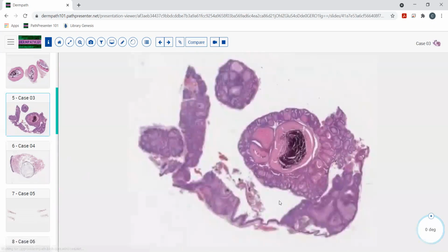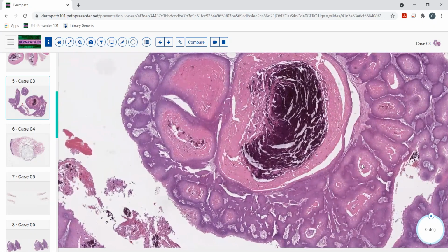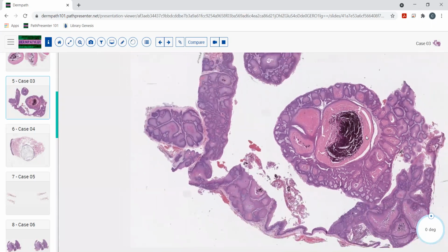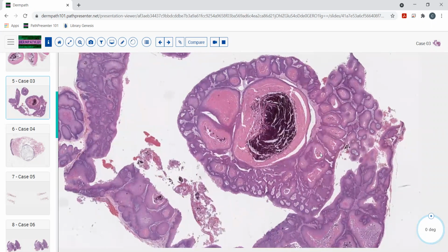Okay, so sometimes you get this trichilemmal cyst, pilar cyst, isthmus catagen cyst, where you get marked proliferation of the cystic epithelium. So you see here, they almost look like multiple little tiny trichilemmal cysts that basically have kind of come together, lumped together, if you will, to form one giant lesion. And this is what we call a proliferating trichilemmal cyst. Some people also call it a proliferating trichilemmal tumor. WEN is another name that's been applied to these.